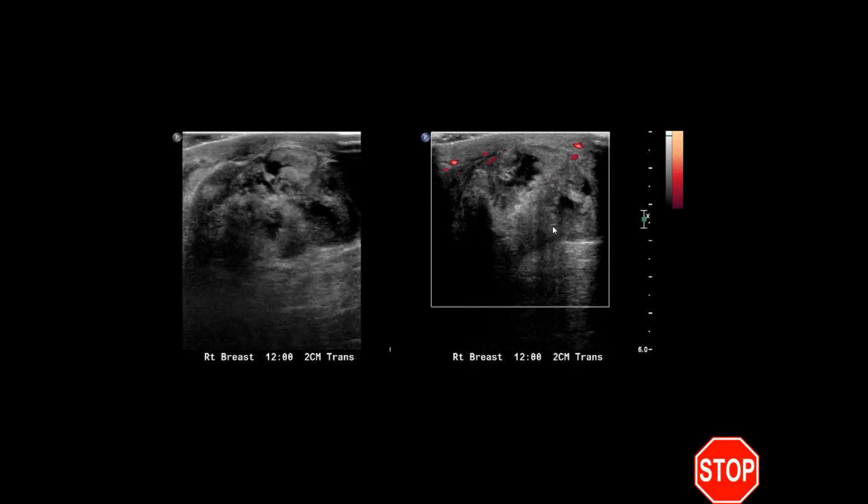So, you know, mastitis, you expect to see a lot of hyperemia. With an abscess, sometimes you can see hyperemia, sometimes you don't. Galactocele, you wouldn't expect hyperemia. A galactocele and an abscess can both be a complex mass with cystic and solid components, and mastitis can also get some fluid from edema because there's not a ton of drainable fluid here, it looks like. And then, of course, you're always concerned about invasive ductal carcinoma, which, if it was a necrotic and rapidly growing tumor, could have focal hypoechoic areas representing necrosis.